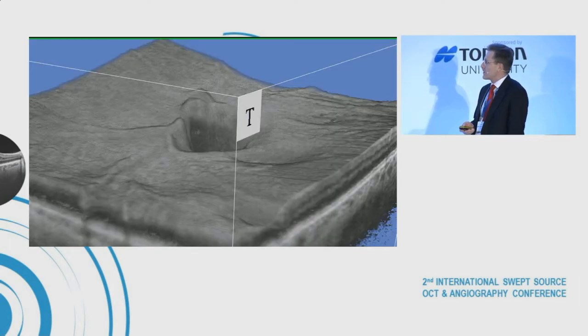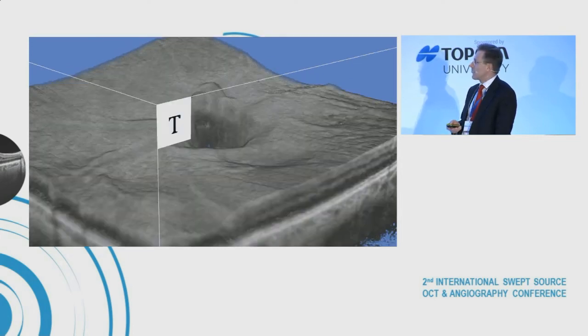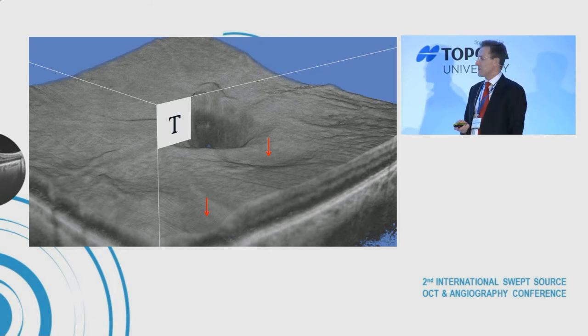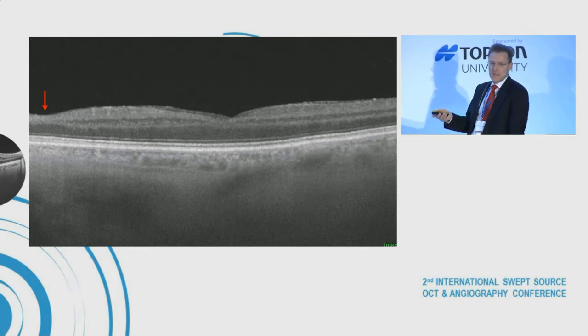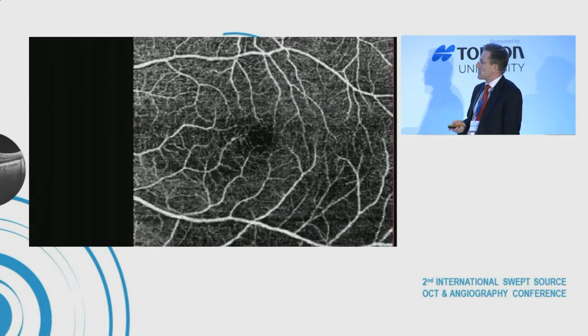And here's another patient where I was searching for a cave, but what I found was 2 depressions in the surface, here and there. And this patient is interesting because I saw him 19 years earlier with retinal vasculitis, and he had activity in those 2 spots, and now he still has retinal sensory defects where he has lost inner retinal tissue, but there has been no progression.